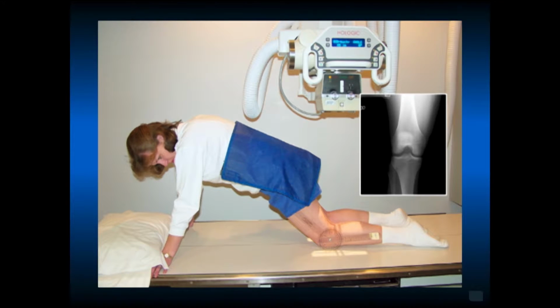And then this is the classic notch view. We get this notch view to look for osteochondritis dissecans of the femoral condyles in adolescents. If we're measuring the width of the notch as it relates to the size of the ACL, if we have notch stenosis, we can measure the absolute width. More commonly, we measure the width of the notch and then also the distal femoral width, but the x-rays need to be standardized to get the same degree of flexion and position.